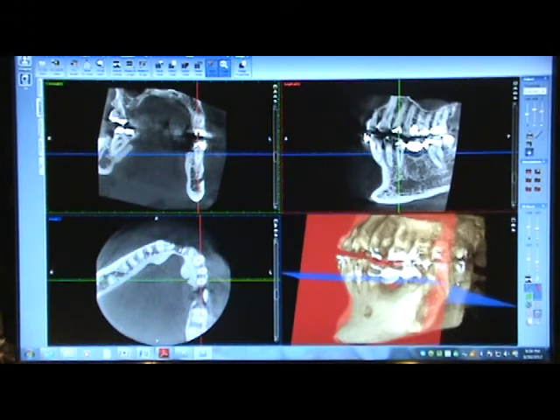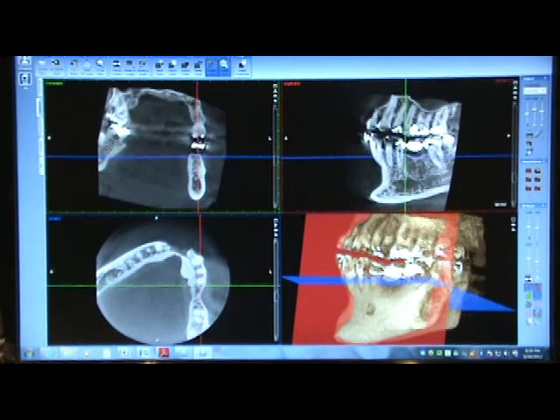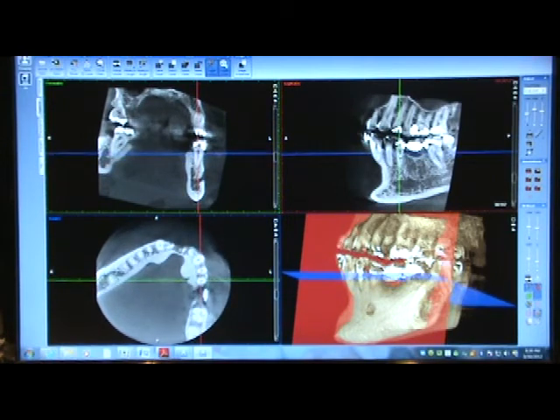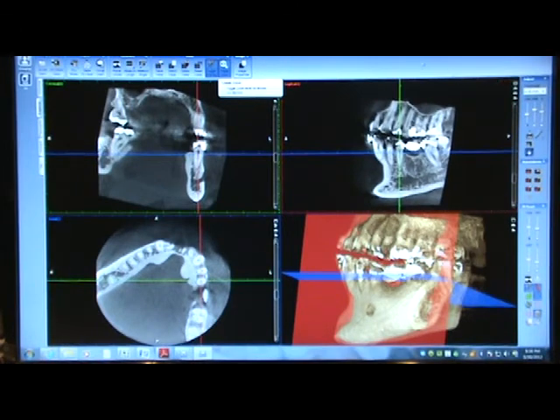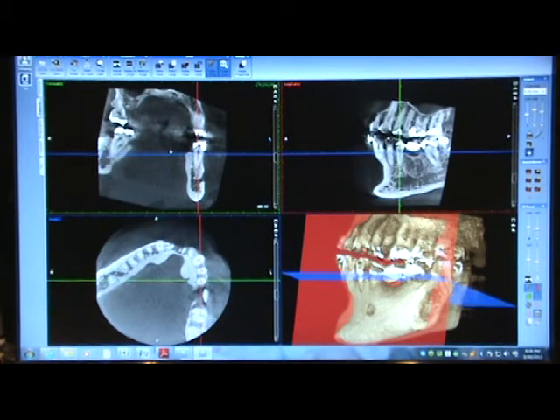Okay, there we go. Now, one thing you want to remember is that the top right here, the move and rotate volume button, is highlighted. That allows us to right click and move our different planes. When it's unhighlighted, that will not work, and if you move, that'll cause planes to move in a certain section if you want to target an area. So let's go over and highlight that. Also, the toggle zoom button, as long as that is highlighted, you can move in and out with your toggle wheel. And your toggle overlay button shows your measurement lines.